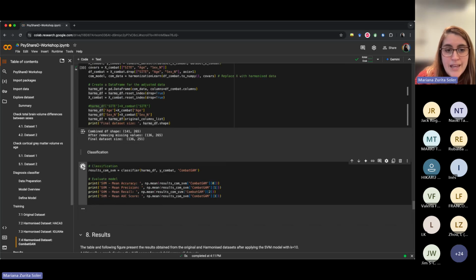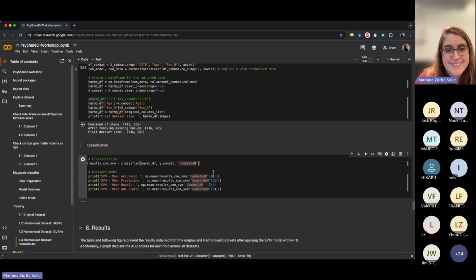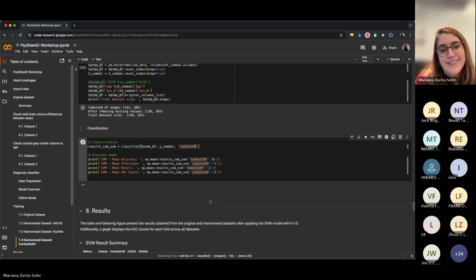It's very quick. And then we run our classification with the ComBat GAM NeuroHarmonized data. While it's running, please remember that you can put your questions in the chat. Ruba next to me is looking at the chat and ready to answer any questions. If you have any afterwards, I'm happy to also answer by email.